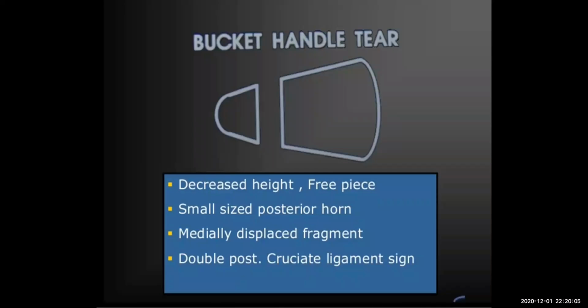Okay, if you find the knee flexion deformity and it springs back, this is again a sign of a bucket handle tear. When you go for the MRI, and you have it from the history and then from your examination, you are predicting that this patient has a locked knee because of a medial meniscal tear. When you go to the medial side, you are expecting to see this huge posterior horn, triangular shape, black meniscus, and then you find it small, decreasing in size.